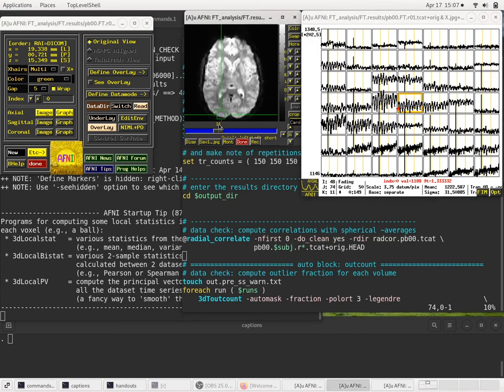This box is getting big, so now we've got 7x7 here, 7 voxels by 7 voxels, so our green box is a 7x7 box. And so just to reinforce the fact that this grid is matching, it's an axial graph window, so the voxels in this grid match the voxels in the axial image, within this green box here.